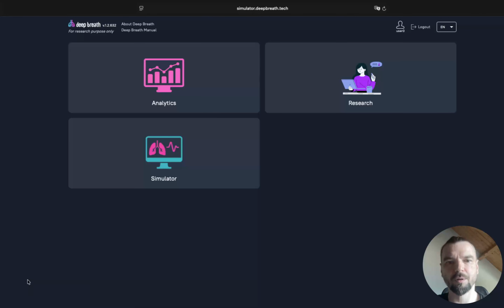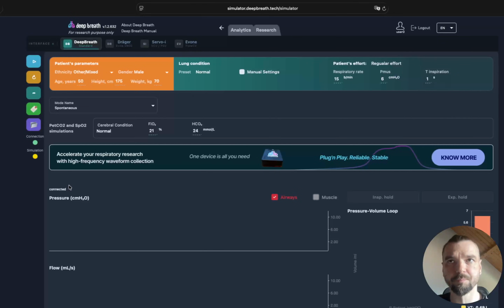Hello everyone, here is a video presentation and manual of our deep breath simulator to simulate patient ventilation interactions in different modes of invasive lung ventilation. When you log in, you see the screen and you need to click on simulator, and you see the deep breath simulation interface, but with a significant difference to previous versions, like the beta version.